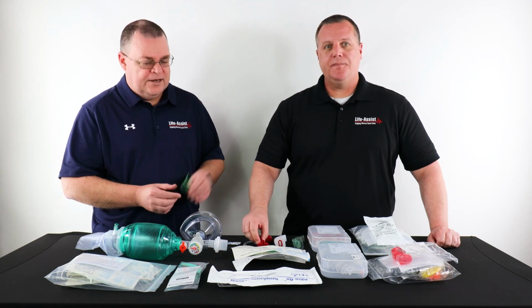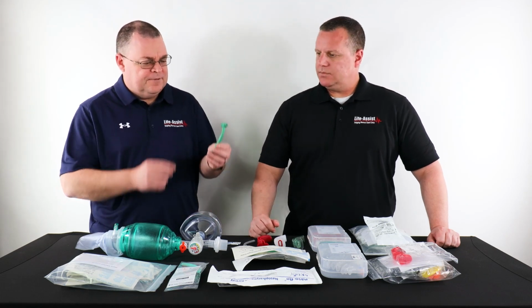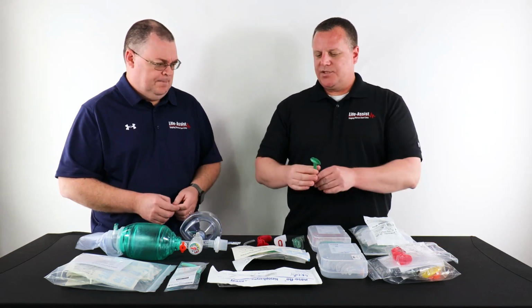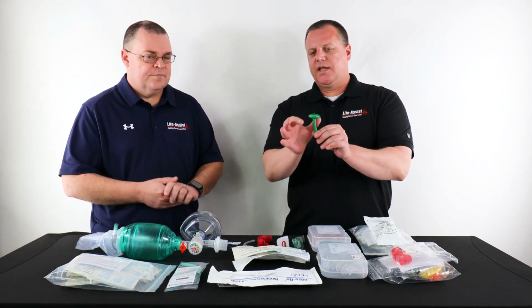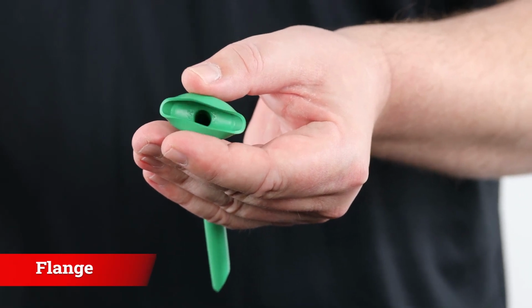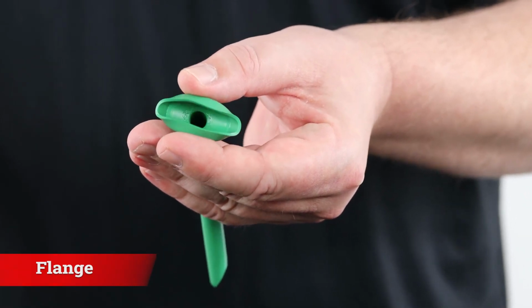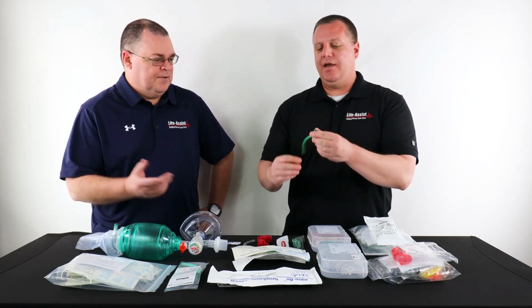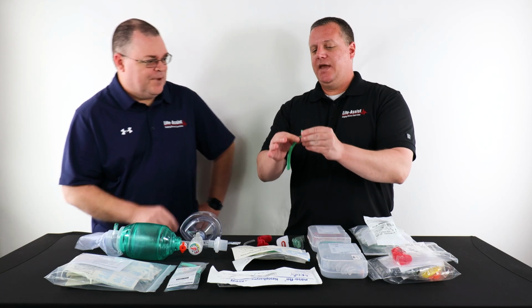Okay. All right. And now with that one, they look kind of similar. You still got something there. What's going on with this one, the NPA? Yeah, similar to the OPA, this is again the flange. This is so when we stick it in the nose it doesn't go down too far. This keeps it from going down too far, and this sits right at the nostril. It would be kind of hard to dig it out with the wires. It would not be fun. And that might be an advanced skill.